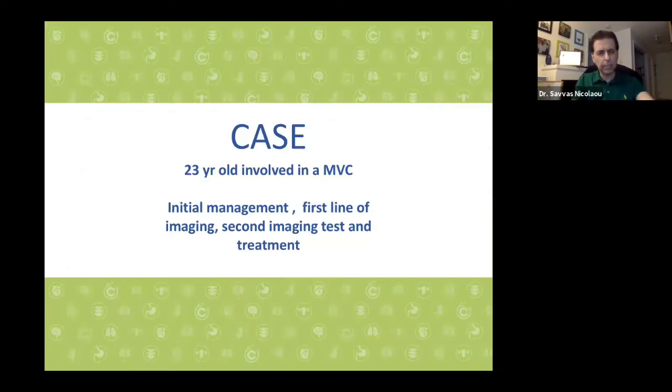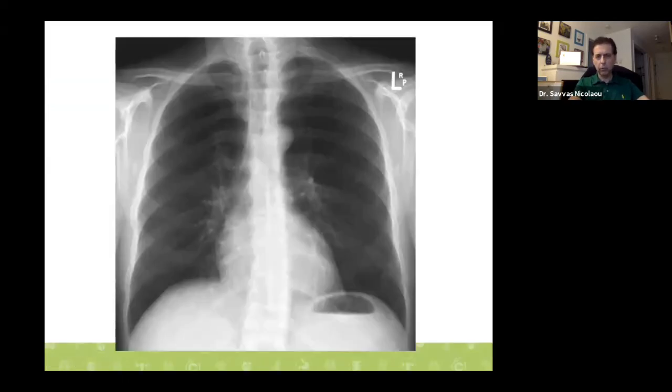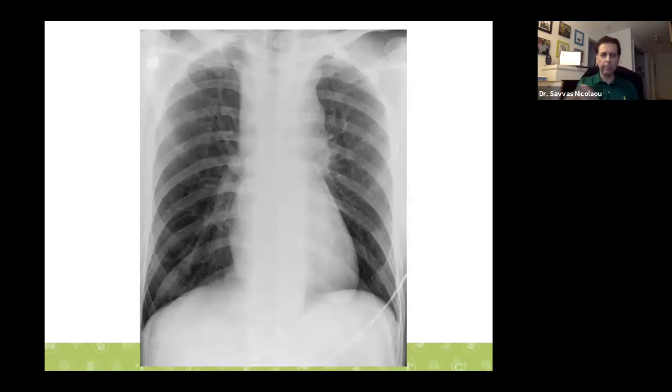Let's look at a few last cases before we finish with the last 5 minutes of my talk. 23-year-old involved in MVC, initial management, first line imaging test, second imaging test. First, X-ray. Normal X-ray, abnormal X-ray. What's the abnormality? Striking abnormality, wide mediastinum.